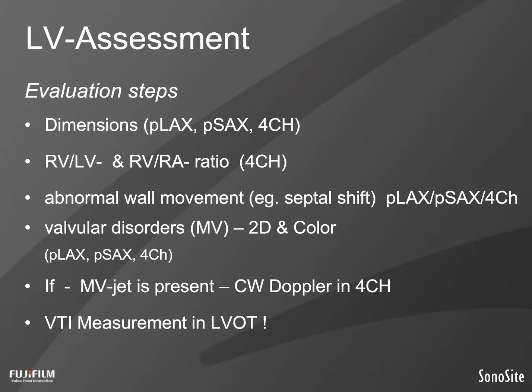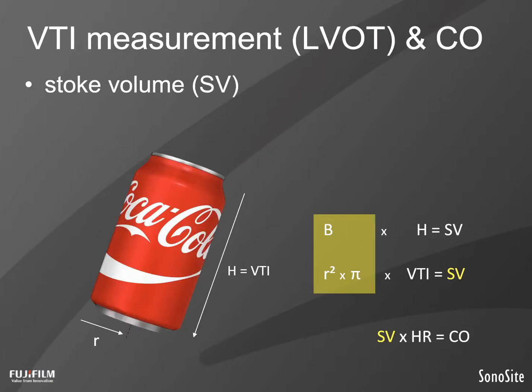In contrast to the right ventricular assessment, within the left ventricular assessment, velocity time integral measurement in the LVOT is essential in order to evaluate left ventricular function. VTI measurement is essential for cardiac output calculation.